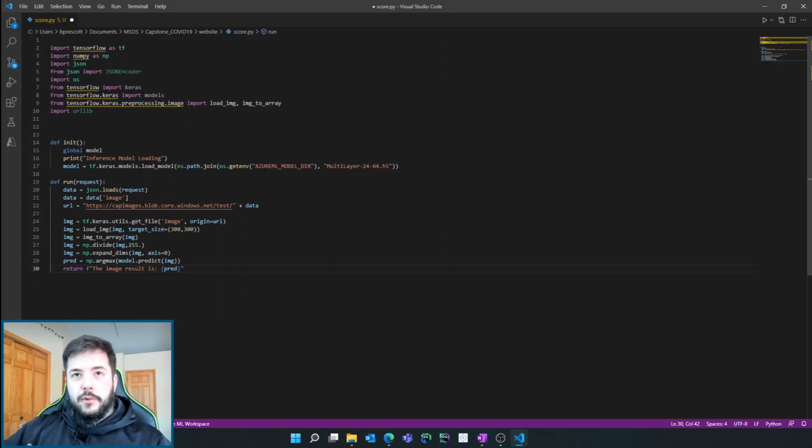In that case, it may return something like 0 is 0.7, 1 might be 0.2, and then 2 might be like 0.1, right? So in that case, that'd be 70%, 20%, 10%, so that adds up to 100%. In this case, all it's going to return for value is which one of those labels had the largest value, okay?